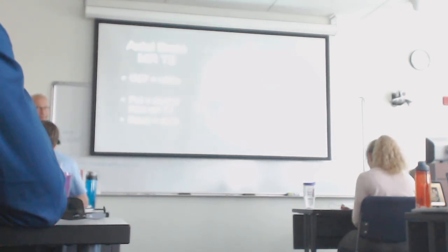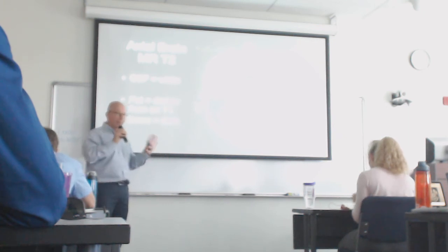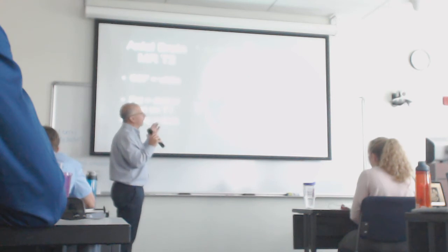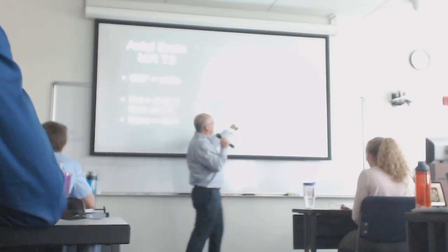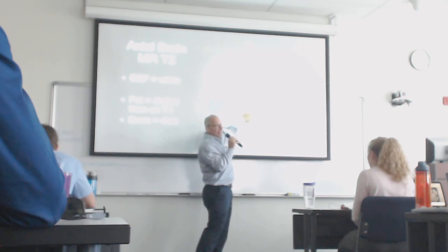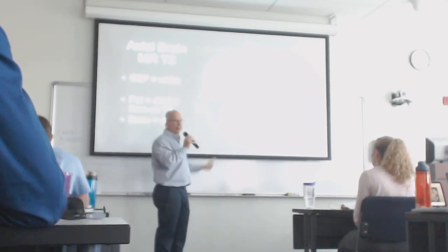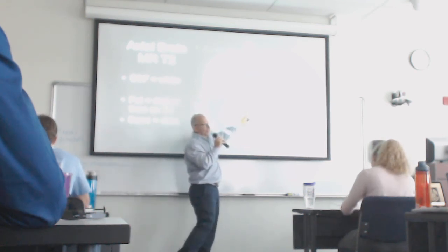T2 weighted brain image, T1, T2. You don't have to know. I'm not going to pimp you on the difference between T1 and T2. I promise. Okay. I have to remind myself, but I'm not going to do it. But on T2, water is white and fat is grayish, grayer than on T1. But this is really important for us. Water is white on T2.